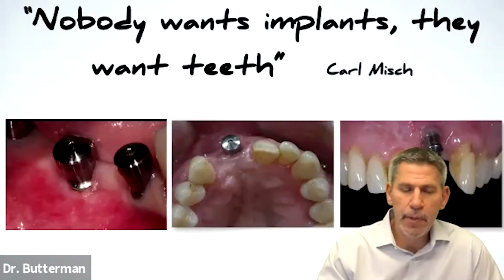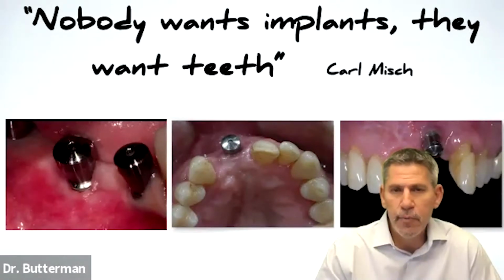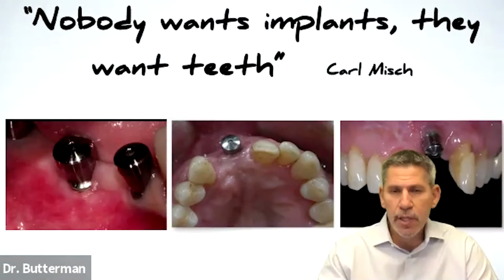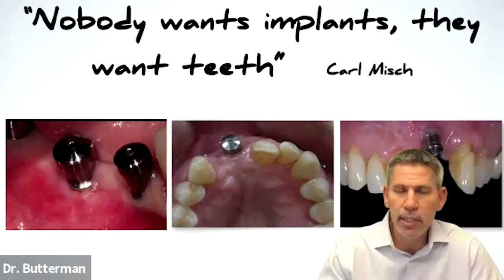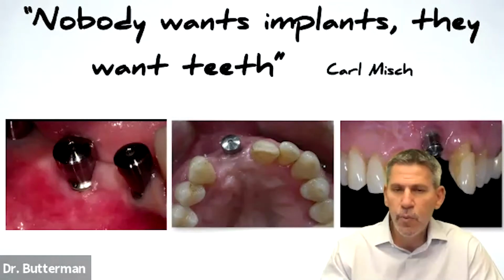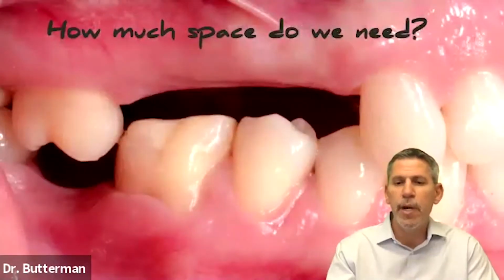So let's jump into the implant side. As Carl Misch used to say, nobody wants implants, they want teeth. And we sometimes forget that. We sometimes focus on the implant first, and we put the implant in the right position. But then when it comes to putting the tooth in or the restoration for the patient, then we get stuck. And now we're dealing with a lab that's kind of reaching out and saying, hey, we've got to compromise with this case. So in my opinion, we really need to focus on the restoration, and then the implant is going to follow. And that's typically how I'm going to do it in my practice.